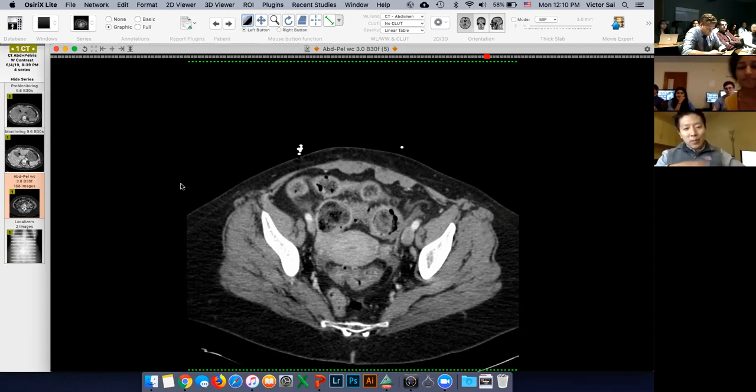And so in a patient who has risk factors for that, we could suggest that higher up. I didn't really say that it was infectious or inflammatory, but that's because I just had a strong suspicion that that was going to be ischemic colitis.